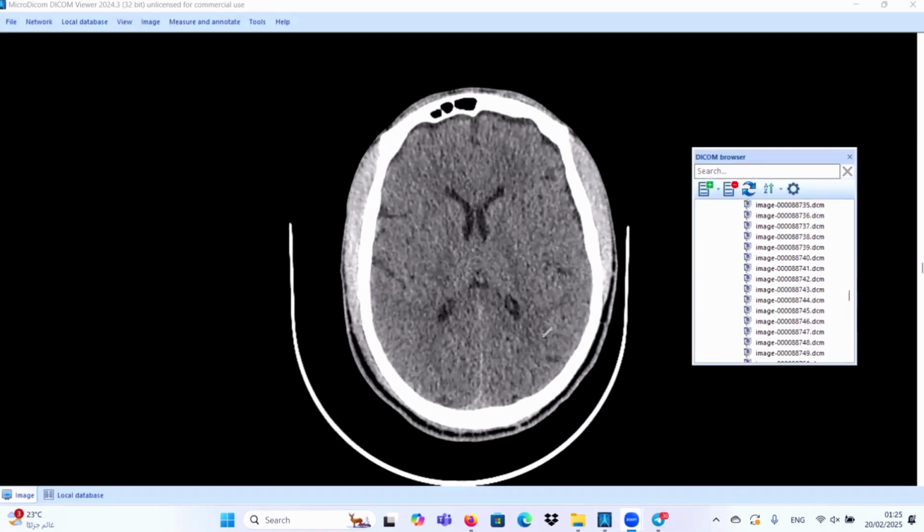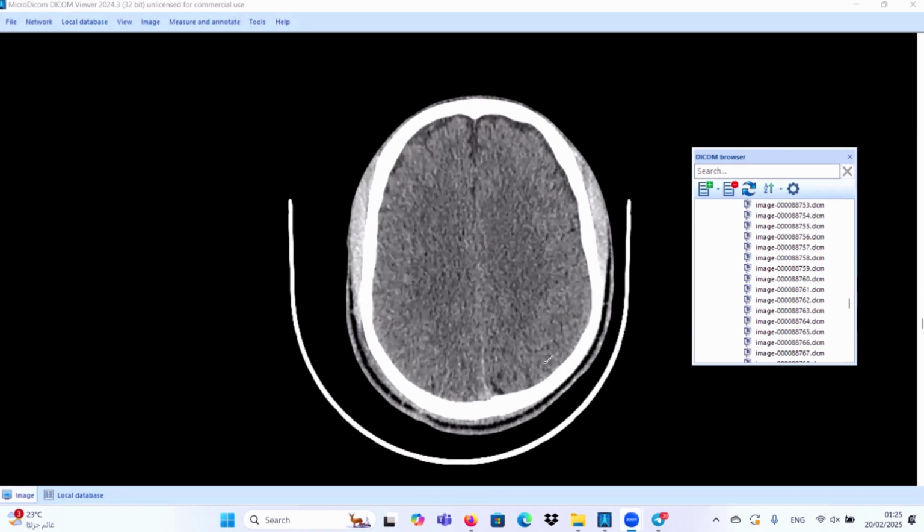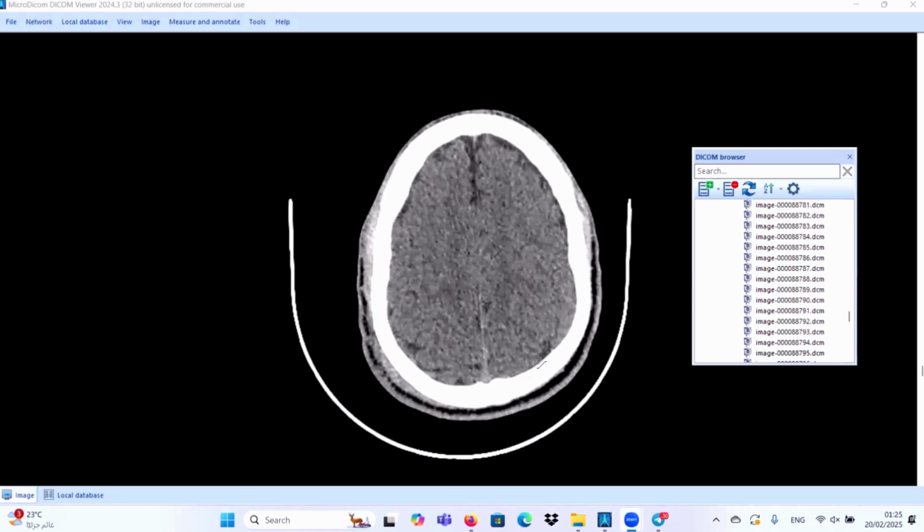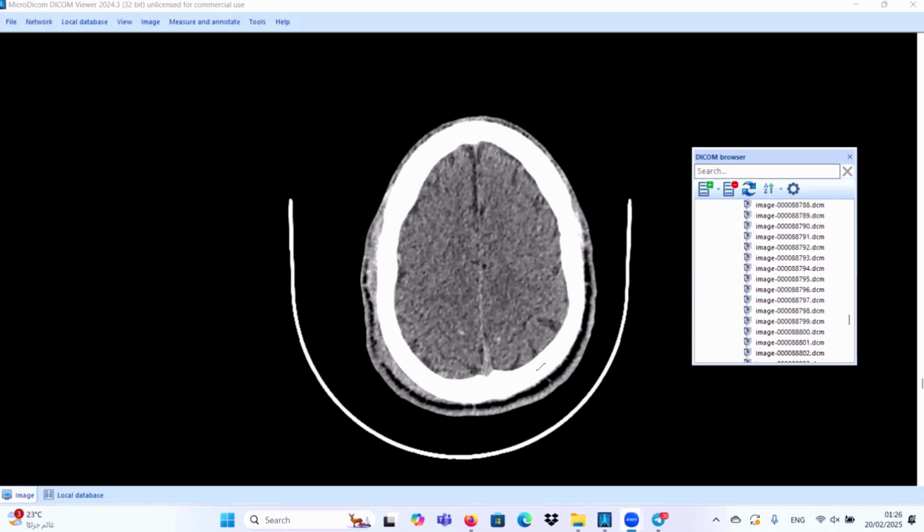This is our third case today, a trauma patient, and the most significant abnormalities are these areas: some petechial hemorrhage located at the high parietal region, at the gray-white matter interface. We have also some petechial hemorrhage here and here. The first possibility in these cases, once we have a trauma case and we have subcortical hyperdense hemorrhagic foci, is diffuse axonal injury.